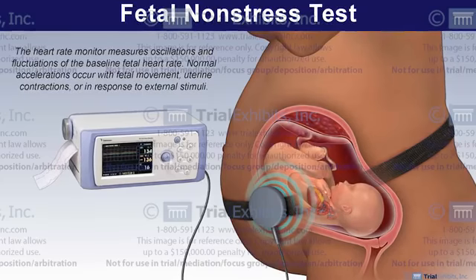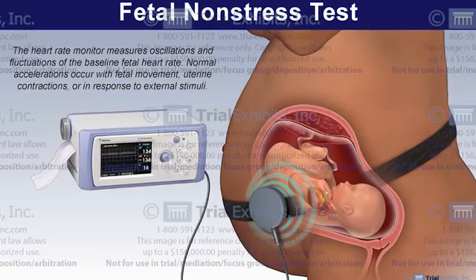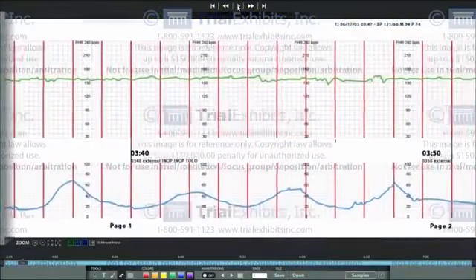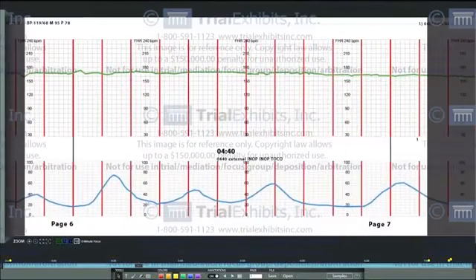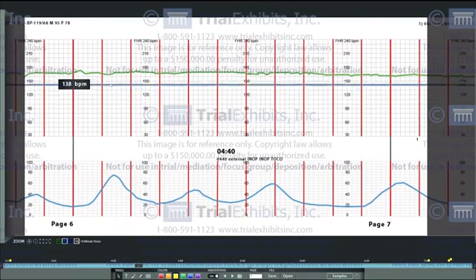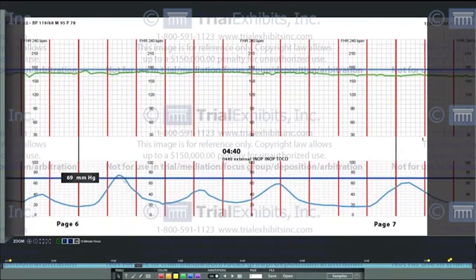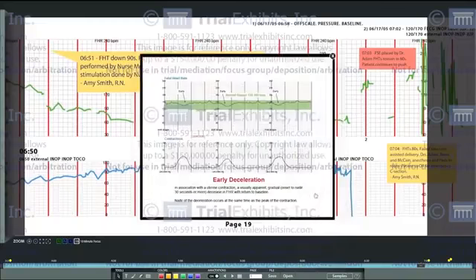Regretfully, the fetal monitoring evidence was quite voluminous in this case, and we could not simply print a few of the strips. The trial exhibit solution was an interactive fetal monitoring strip viewer that would allow for an electronic display of the entire collection of strip evidence. This viewer allows for scrolling back and forth through the strips, the placement of annotations and tab lines, and the incorporation of comparative strips showing classic examples of fetal heart patterns.